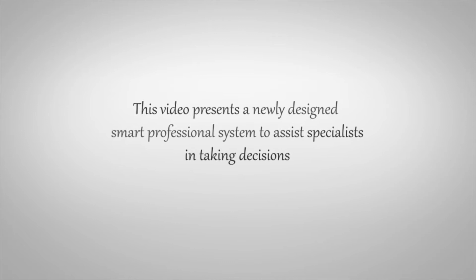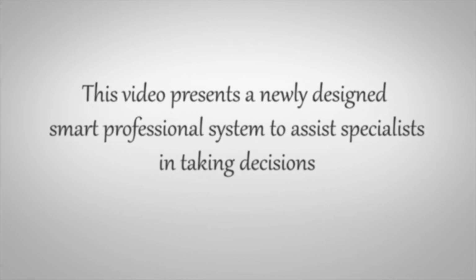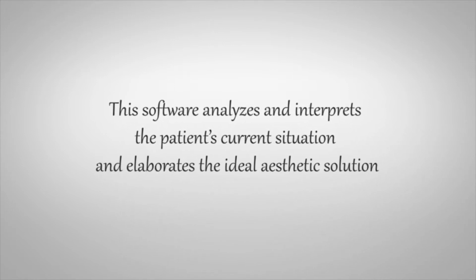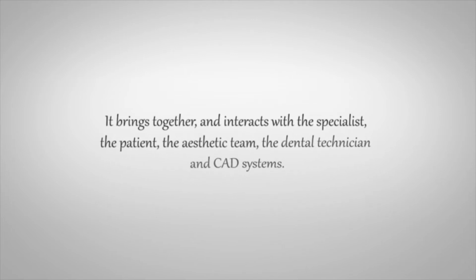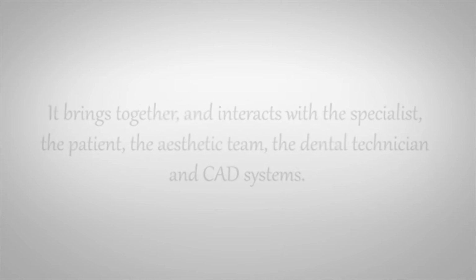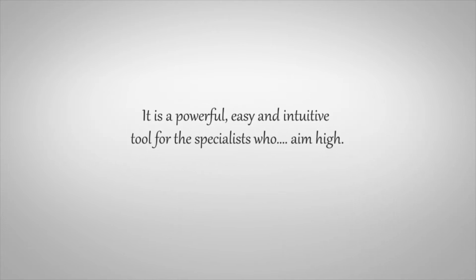This video presents a newly designed smart professional system to assist specialists in taking decisions regarding smile and face aesthetics. This software analyzes and interprets the patient's current situation and elaborates the ideal aesthetic solution. It brings together and interacts with the specialist, the patient, the aesthetic team, the dental technician, and CAD systems. It is a powerful, easy, and intuitive tool for the specialists who aim high.